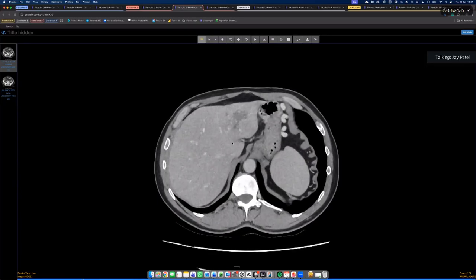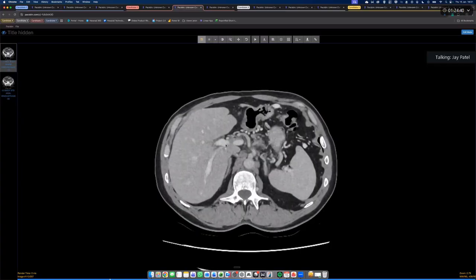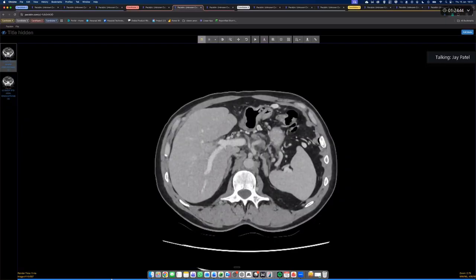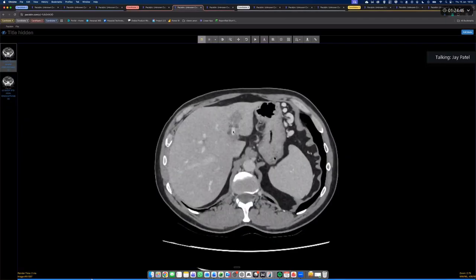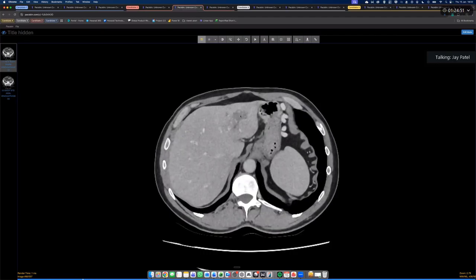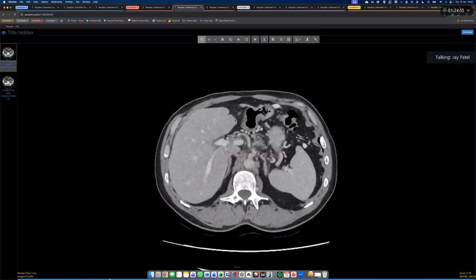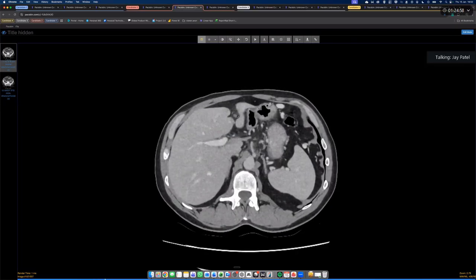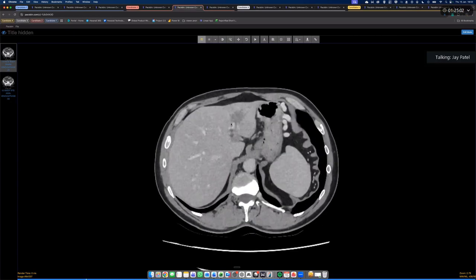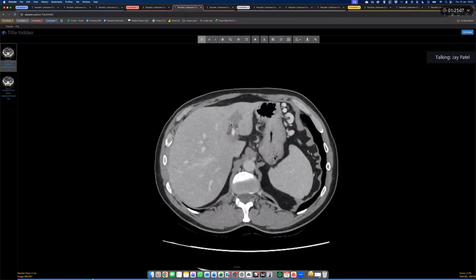And if I look, so you said there was no portal vein thrombus, and I agree, there's no main portal vein thrombus, but this is the right, this is left, and it suddenly just stops there. And all of this is thrombosed intrahepatic portal vein thrombus. And actually, you probably even have thrombus going down into that vessel as well. So probably not a metastatic deposit, probably an intrahepatic portal vein thrombus.